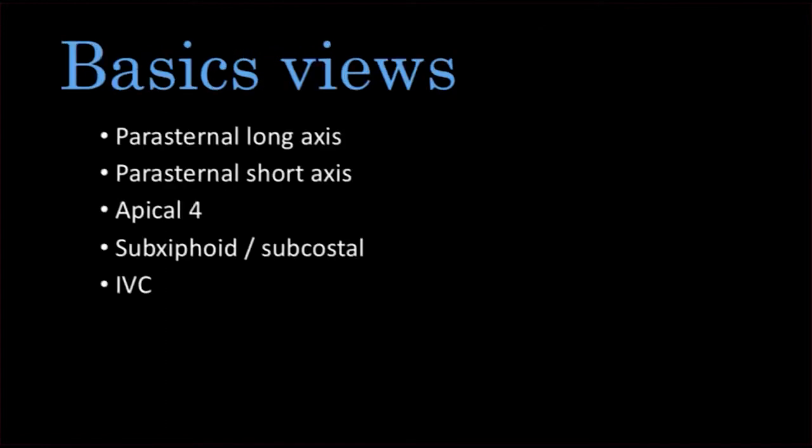There are 4 basic cardiac views and then an additional IVC view. These 4 basic views are a parasternal long axis, a parasternal short axis, an apical 4, a subxiphoid, also known as a subcostal, and then the IVC view.